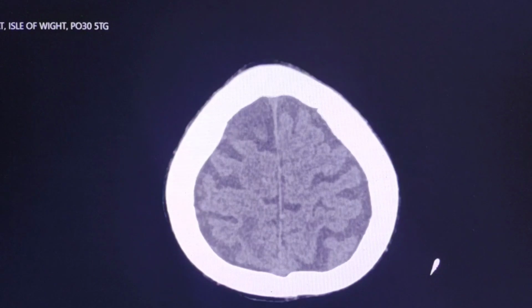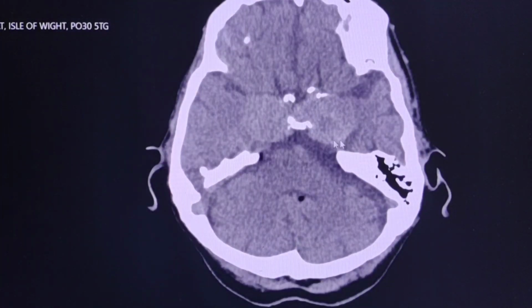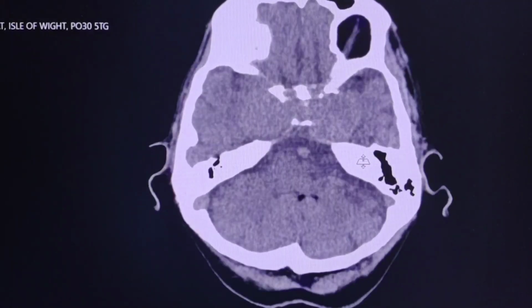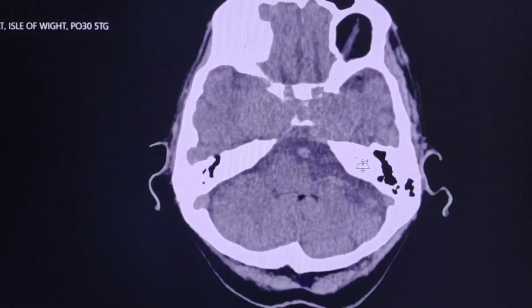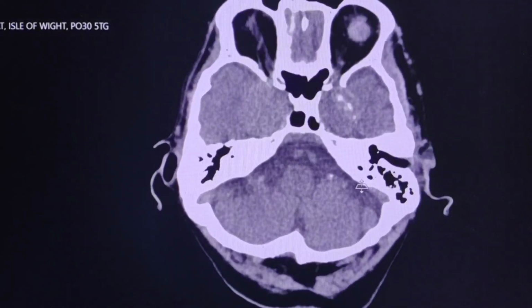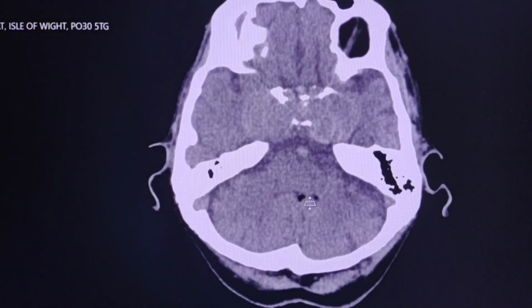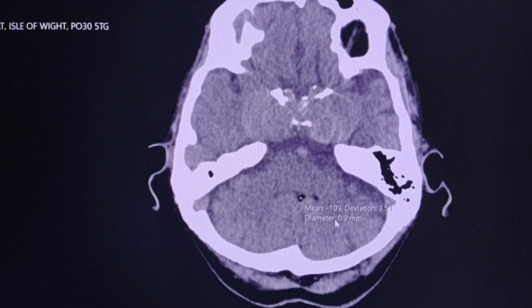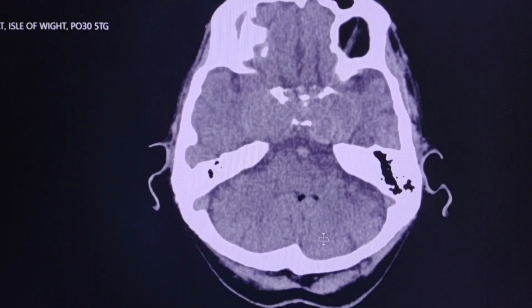First of all, we can see that there are some huge intracranial aneurysms here, but there is no evidence of any complication. Another interesting point is that there are multiple hypoattenuating foci in the subarachnoid space with negative HUs, which represent fat droplets.